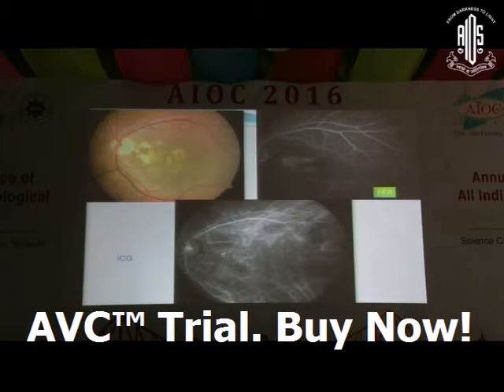It's usually bilateral symmetrical. Here is an example. You can see this orangish lesion. These are typical of PCV with a lot of exudation. If you do a fluorescein angiography, you will see a diffuse hyperfluorescence which leaks in the late phase. But ICG is typical. You can see polyps here.